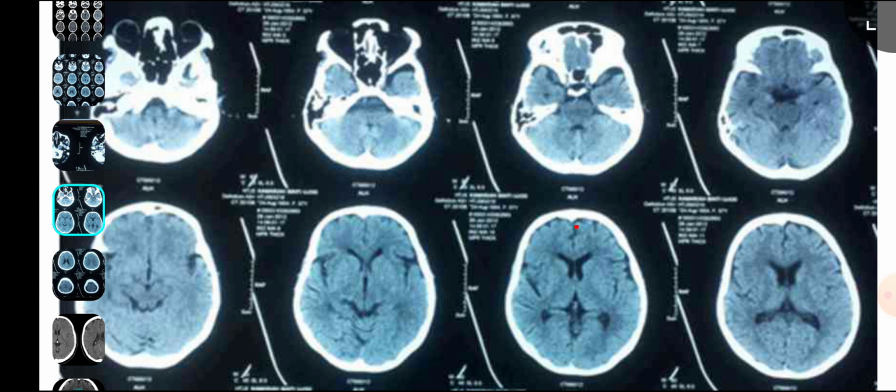Now if you see over here, the brain picture is complete, compared to this one. Here the brain picture is not complete. By brain picture I mean this round thing you see, the brain matter. The picture is not complete here. Okay, there's bone you can see in between. Here the picture is complete. Here again the picture is not complete.